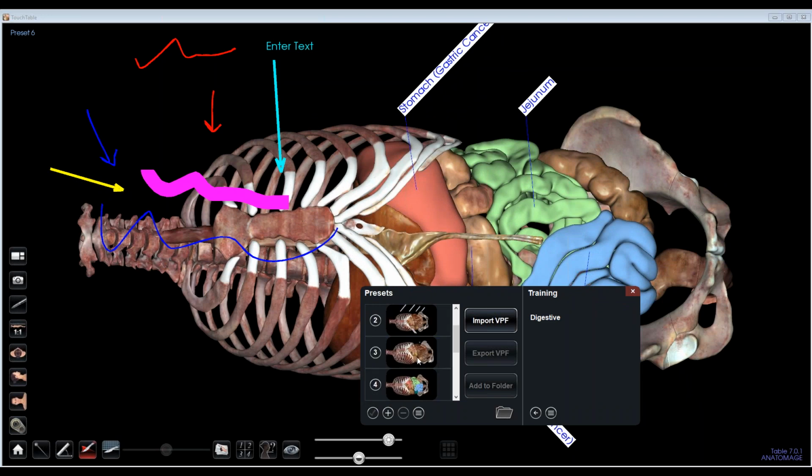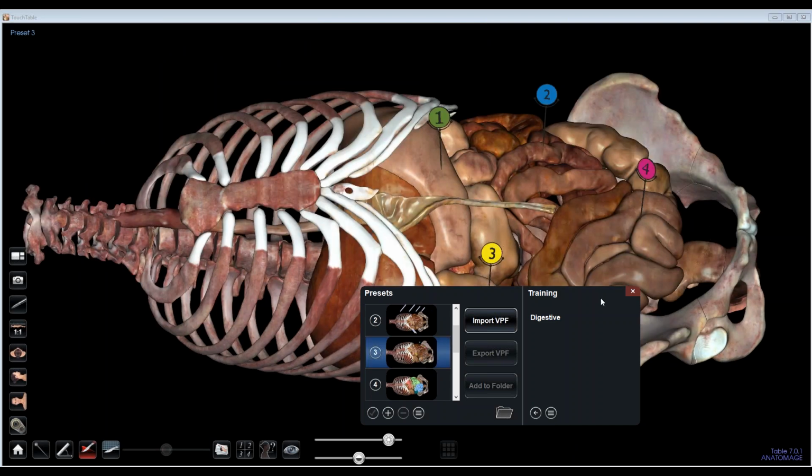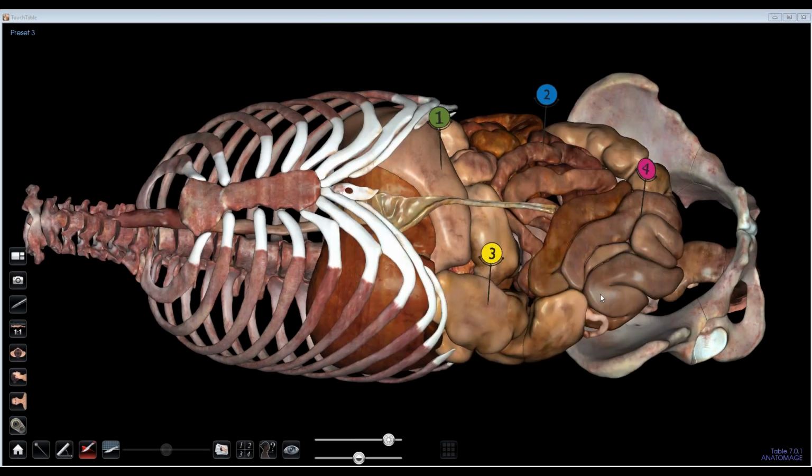And of course, at any point in time, if you'd like, we can take a screenshot. So on the far left-hand side here, the camera icon, you have 3 different screenshot options. So you can take a picture of the entire screen, which includes the icons that you see here in the software. The middle icon is the entire screen without those table icons. And then the scissors icon would be you come over here and choose a section, just like the Windows snipping tool.